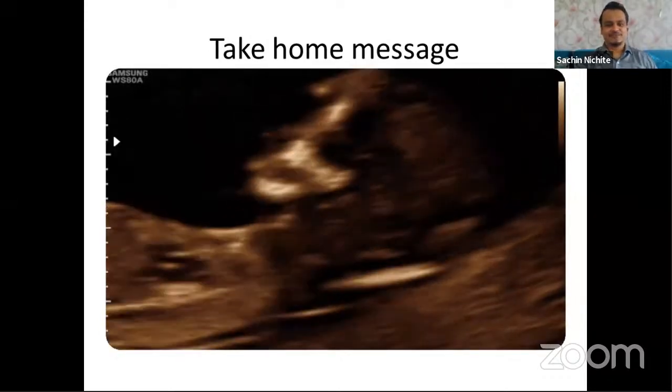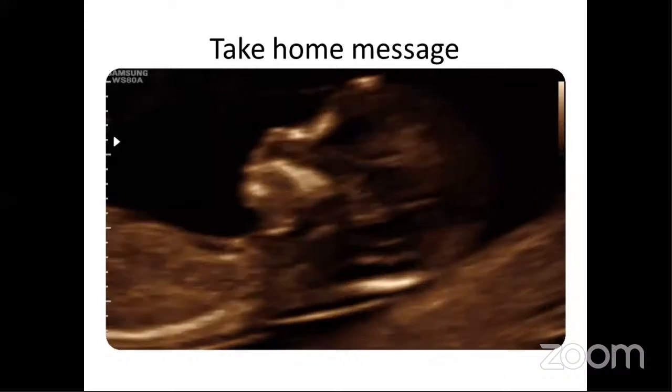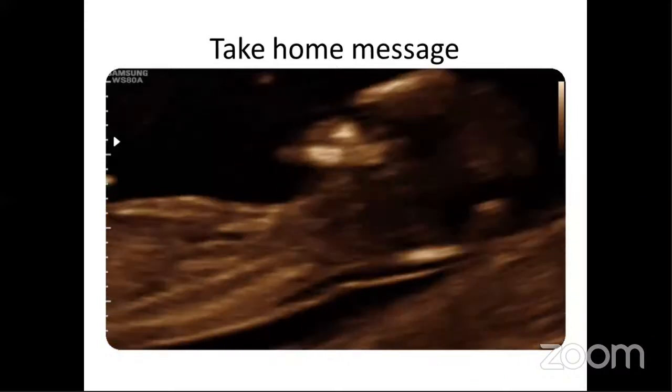Now I come to my last slide. That is the take-home message. The take-home message is not from me. The take-home message is directly from the fetus. Now, what is the fetus trying to say in the clip? If you want to do NT scan, do it in this section or don't do it.